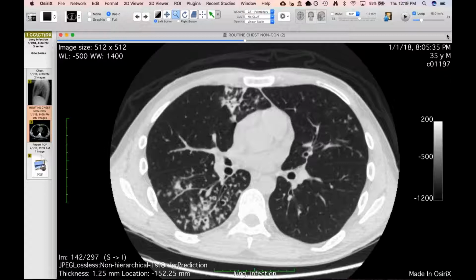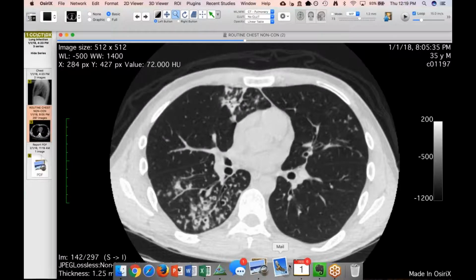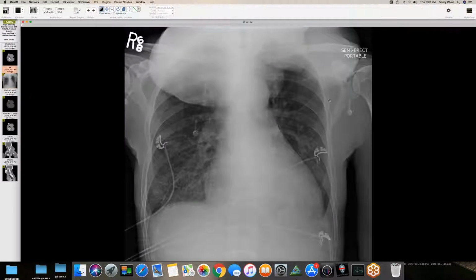All right. Brent, do you have some to show this week? Oh, yes. Good. All right, here you are. Okay, let's see. Okay, let me see. Can you see a radiograph here?